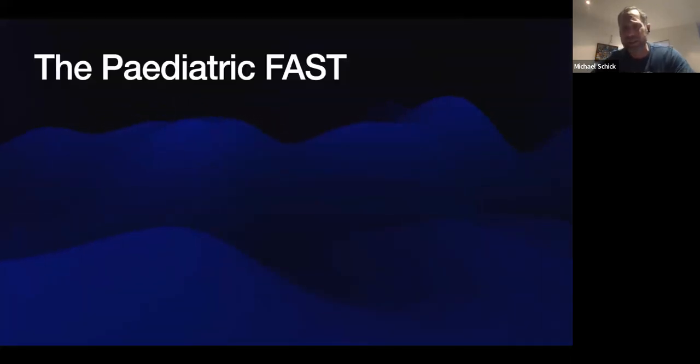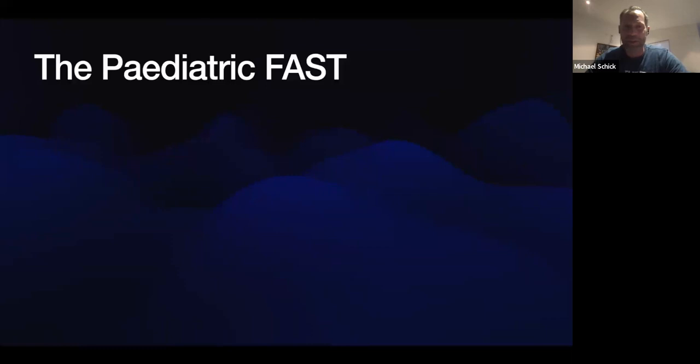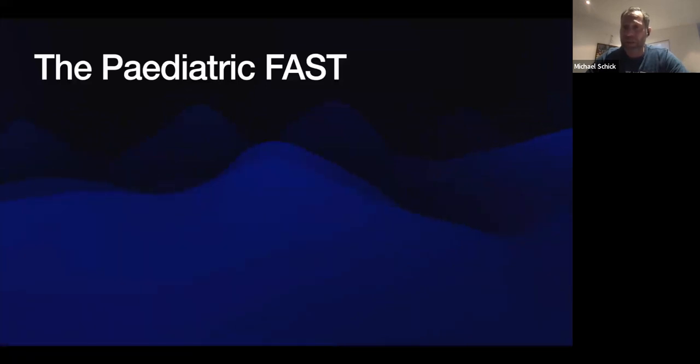So for the pediatric FAST exam, the first question you should ask yourself is, is the pediatric FAST exam the same as the adult FAST exam? And this would be very uninteresting if it was exactly the same, and it's in fact very different. So we have come to rely on the FAST exam in adult patients. It's quite sensitive for picking up hemoperitoneum in blunt trauma patients.